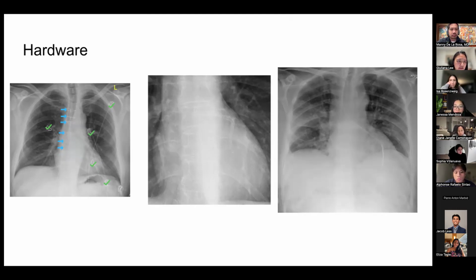Another thing you might see is pretty subtle. Does anyone have something that they notice in this second image? Is that a stent? Yes, sir. That is a stent. It is so subtle, but we love it, and it probably saved this man from a lot of chest pain and perhaps his life. So, stents are important when people come in with a heart attack. It's a blocked vessel in the heart. You send them straight to the cath lab and you get that opened.